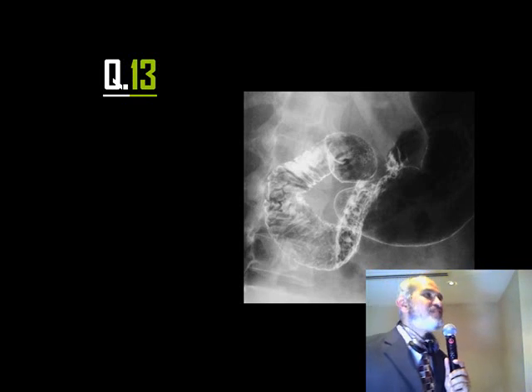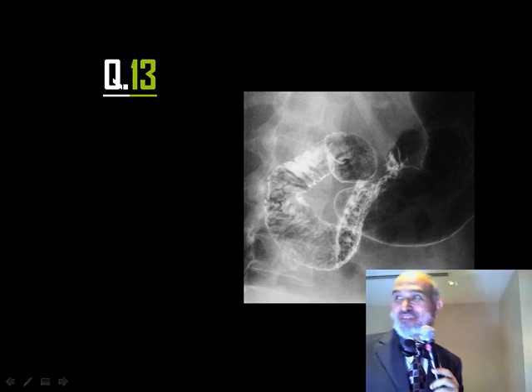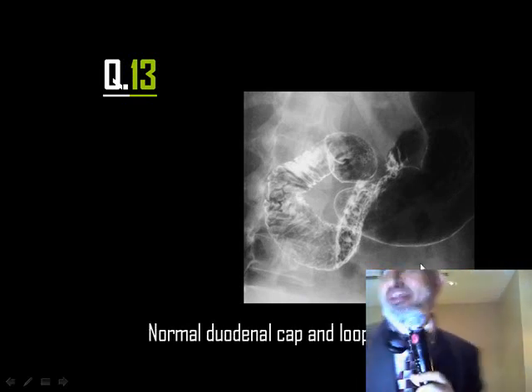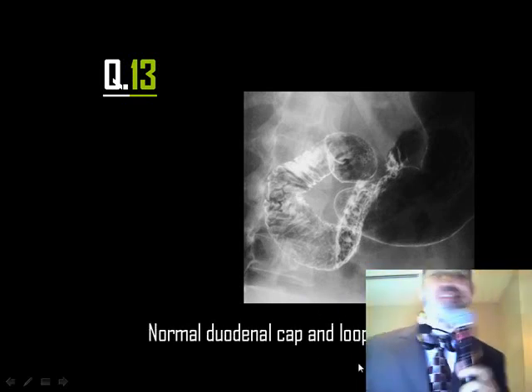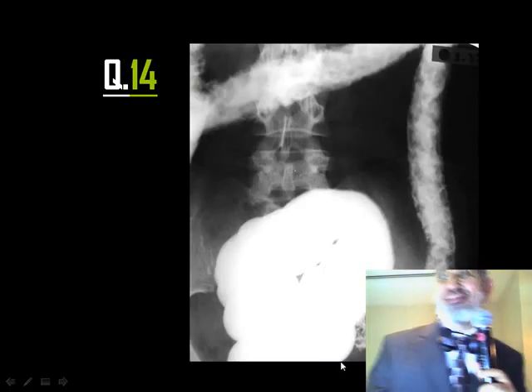Radiologists also can answer. Where? Here? Here? This is normal. Okay, this is normal duodenal cap and loop, and that's why I said it's very difficult.